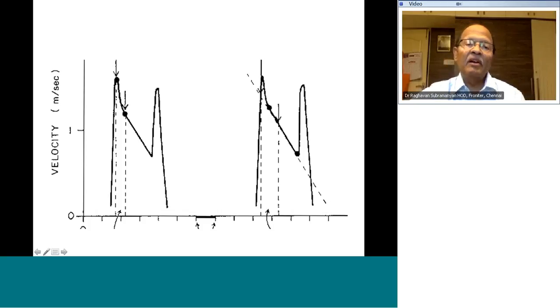Now, the correct method of measurement is not to measure the initial part. The significance of mitral stenosis comes in mainly in mid and late diastole, because in early diastole, even the normal mitral valve may have a small gradient. Therefore, the best area to measure the falling gradient and half time is the slope in the middle straight part of the tracing.